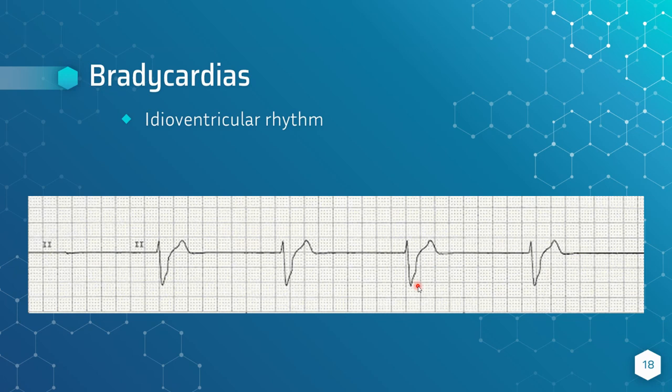Now, let's say that doesn't work. There's also incidences of hyperkalemia. So if all those treatments fail, then it could be due to hyper K. And that's in the literature, and it can cause rhythms to look like this.